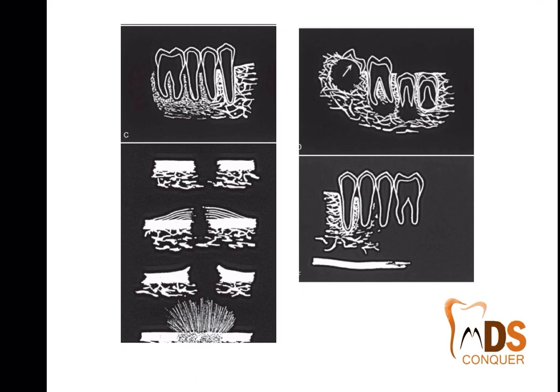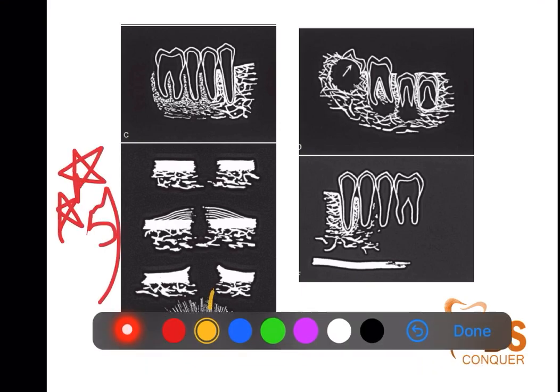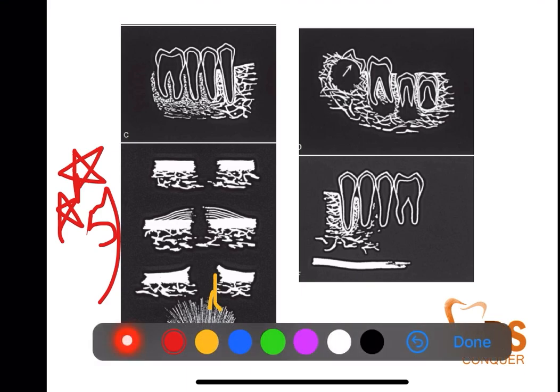So the bone destruction around the existing teeth produces rays, like sun rays. We know the sun ray appearance, where do we see? We'll again show the picture regarding that. So this picture I've posted only to show the sun ray appearance.